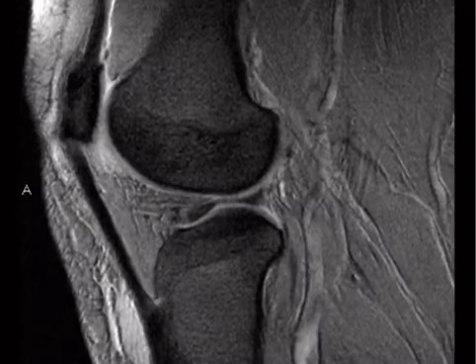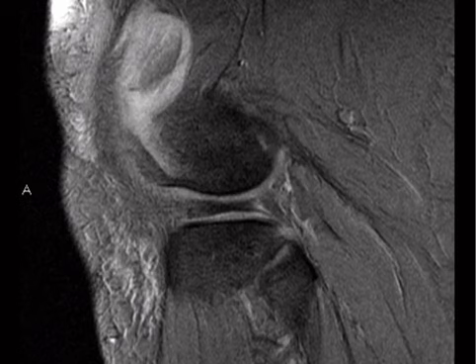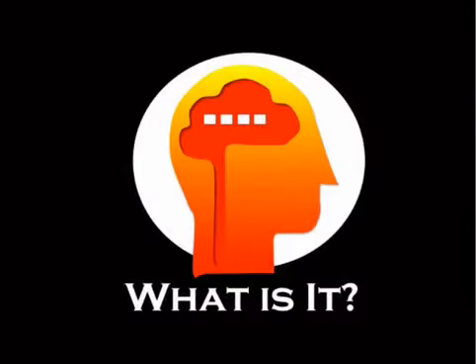But for the purpose of multiple choice, I think it's much harder to show you a scrolling thing where there's multiple bow ties in the sagittal plane. Instead, I think it's more likely to be shown in the coronal. But just be aware, there's this idea of too many bow ties or not enough bow ties for people that look at the meniscus in a sagittal plane.